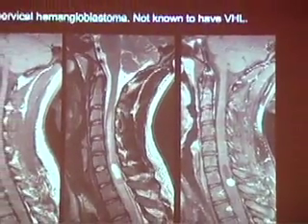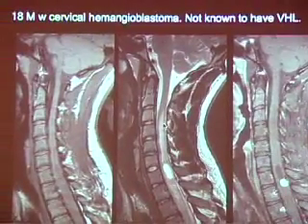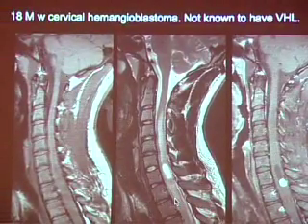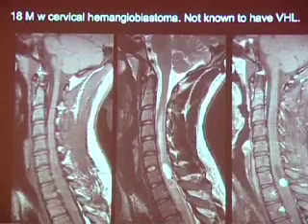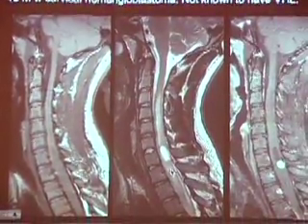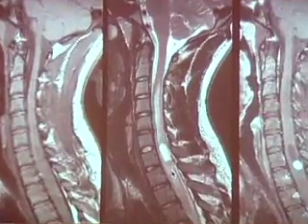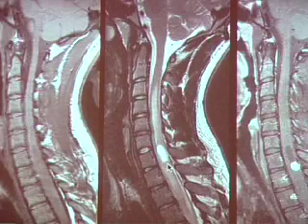The cord is fat and expanded. We see a cyst and a nodule and lots of edema. Why is this not an ependymoma? Well, just on the T2 weighted image, it looks pretty similar to the guy that I just showed you. But ependymomas do not typically have so much cord edema associated with them. I suppose maybe one could, but they don't usually, whereas hemangioblastomas often have a lot of edema.